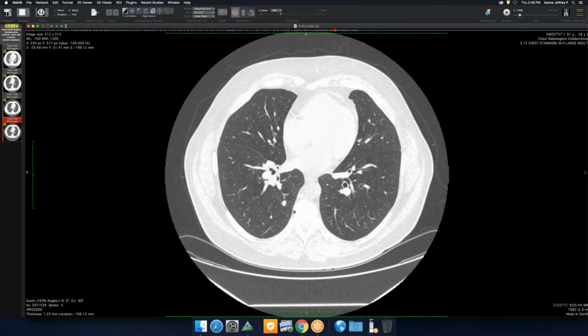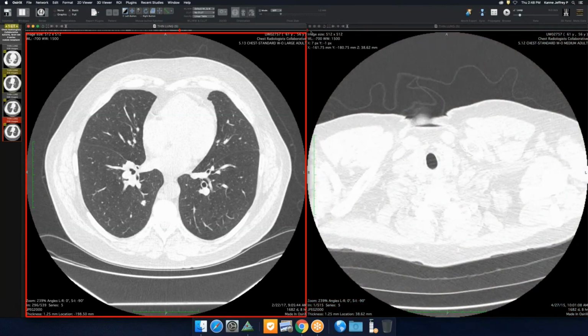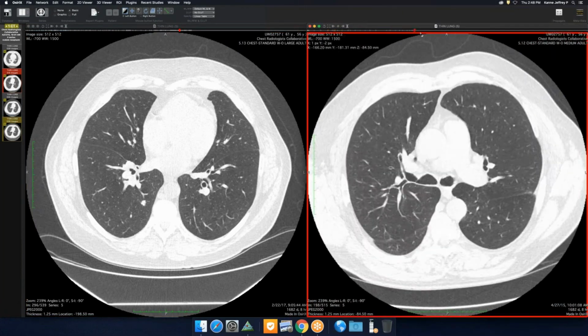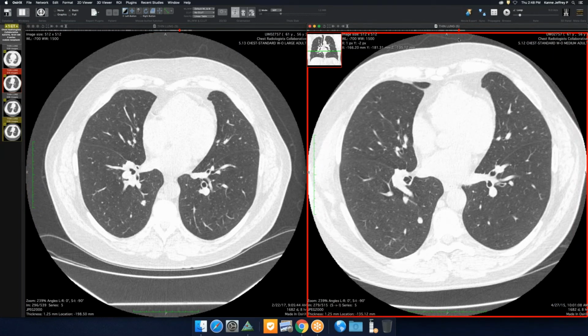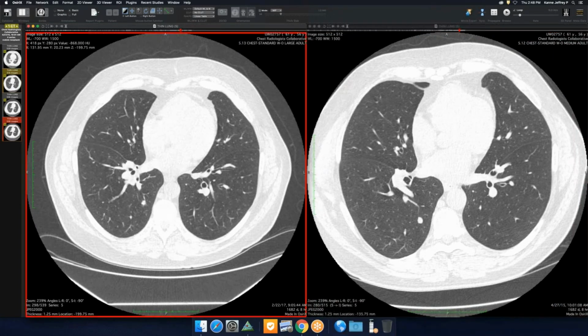It has a history of tobacco use, and you've got the spiculated lobulated nodule. It looks like a little lung cancer. It was recommended for the appropriate follow-up based on Fleischner, and this was with the new Fleischner, so 2017. And with due diligence, it was followed. And at 2 years, the nodule was deemed to be stable at another hospital. So these were all done elsewhere.